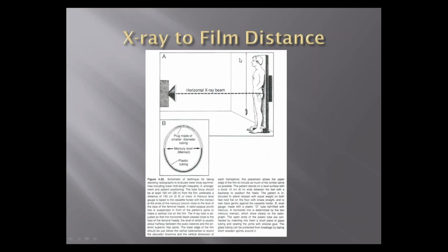The digital ones, they've kind of solved that issue. We don't really need it, because what could happen is the film didn't sit perfectly right and the film could shift, but now you're going to a plate, it doesn't really shift anymore. So that plumb line really isn't as necessary as it used to be. And this mercury level, which was an awesome invention, she was super smart, but again, not necessary because they kind of standardized all of that stuff at this point.